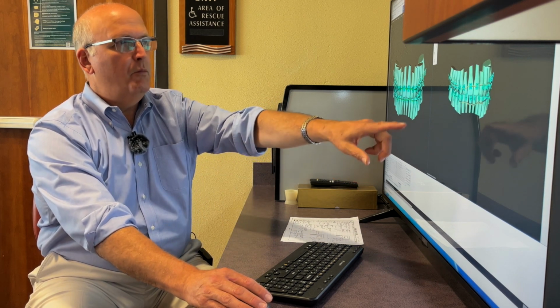This process you're observing is teeth and braces that have been scanned, and teeth that have been moved to a finish line from a previous position or starting position to then a finished position.